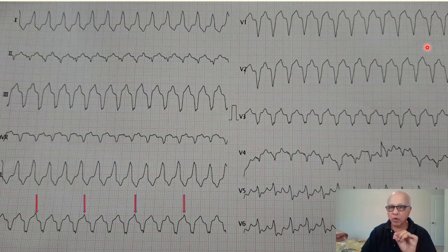Now we'll go down. There is one more point. If you look at the precordial leads, I said concordance. That is all the QRS complexes having either positive or negative polarity. That is called concordance. That is also not present in this ECG. Is there a fusion complex in this ECG? No, there are no fusion complexes. Are there capture beats, that is occasional sinus beats? There are no occasional sinus beats. So these are points which tell you that this may not be VT.